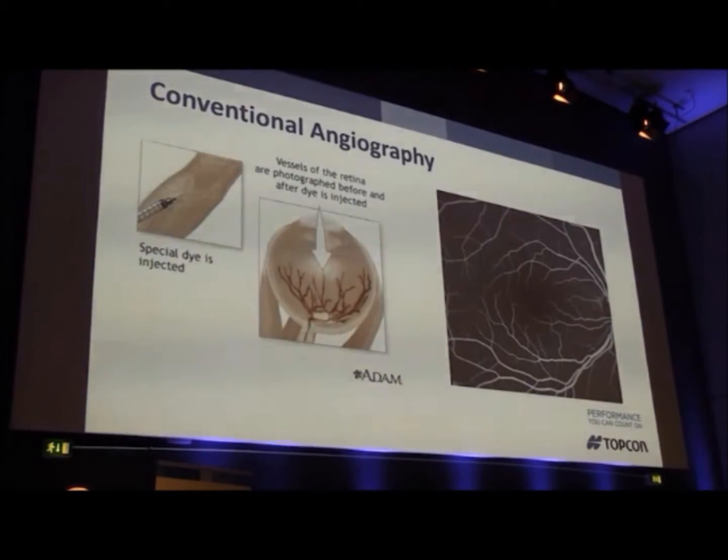So in traditional fluorescein angiography, you obviously inject a fluorescein dye, and you can see my right eye as it's visualized in the fluorescein. You see the major vessels, but you don't see a lot of the deeper plexus. And that's a very, very important issue.